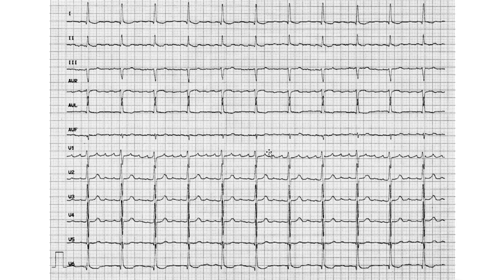But we don't rush. We look through, and clearly in lead 2 as well, there's this regular, uniform thing that does not look like a P wave. Definitely that's not a P wave. So we say non-sinus for this point. Third point, we calculate the heart rate. 1, 2, 3, 4, 5, 6, 7, 8, 9, 10, 11, 12. 12 by 6, and we say that is 72 roughly.